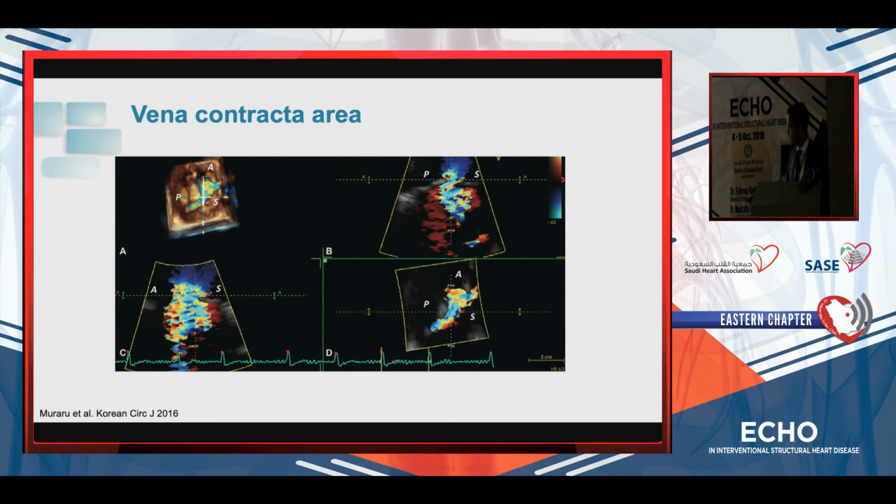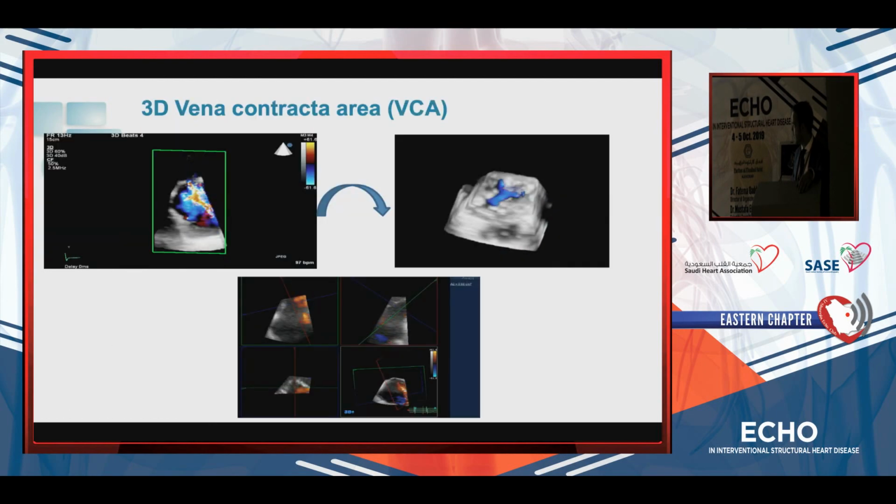just cutting into your 3D box, nicely showing the star-shaped vena contracta area, and do your measurements here, because it has nicely been shown that it... I'm going to skip this for the sake of time.